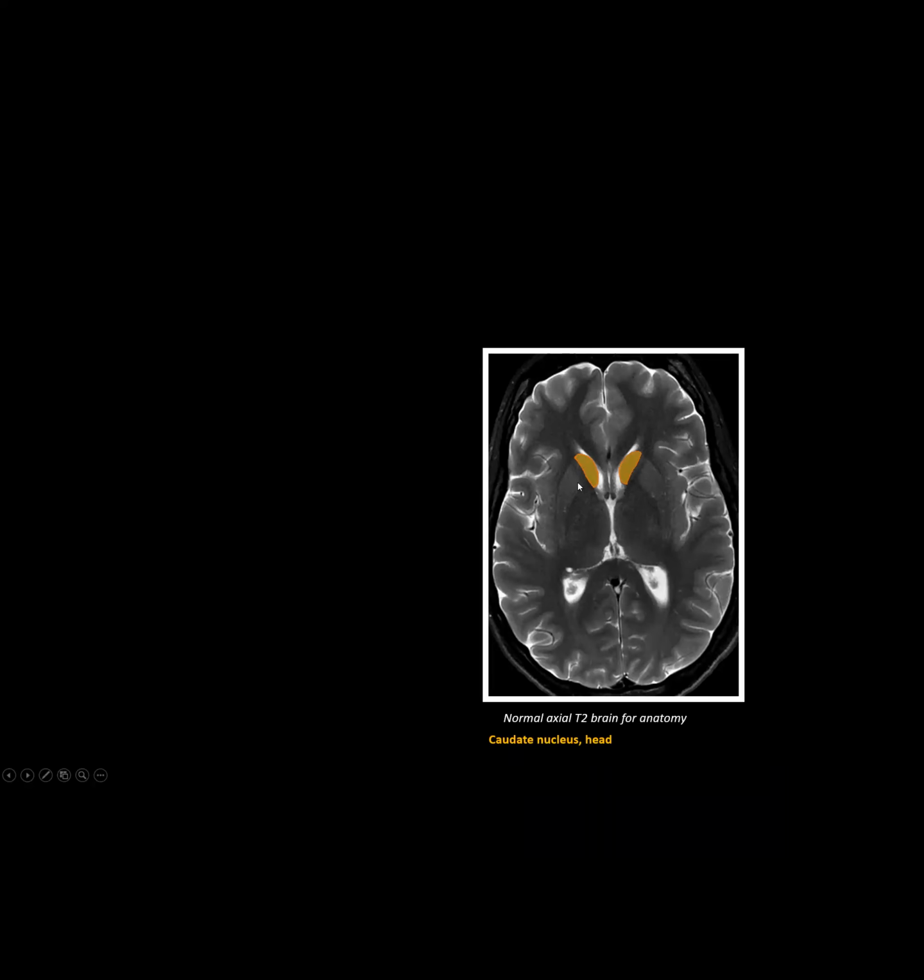Yep. And what structure is this out here? Where? I'm not sure what. I can't see where you're pointing. Next to it? This thing, do you see my arrow? This is just, yeah, but it's not pointing anywhere.